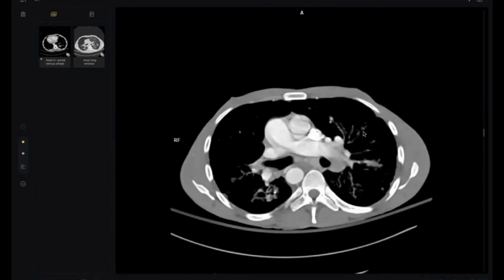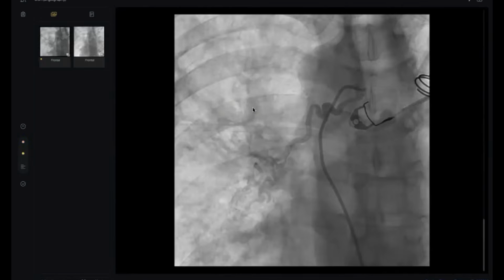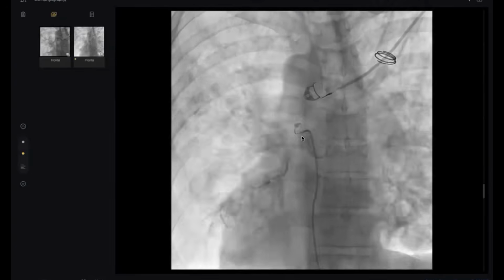So you don't know exactly what it is. By exclusion, it may be the bronchial artery. Your next step is either CT angio or conventional angio like this. They immediately canalize the right bronchial artery and it is tortuous, engorged, and hypertrophied. When it is hypertrophied like this, it can bleed. And the next step is embolization.